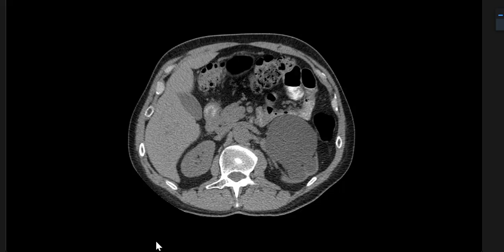So in your case, what I felt is that you were trying too much. You kept on saying parapelvic cyst, large cyst, parapelvic cyst, large cyst. It could be hydronephrosis versus parapelvic cyst. And then you kept on describing there's no stone, there's no blah, blah, blah. I would say it's a classic scattergun approach, where you talk about calculus, then hydronephrosis, then large parapelvic cyst, again hydronephrosis, then ultrasound. Once I tried to interrogate, then you said, okay, I need coronal images.